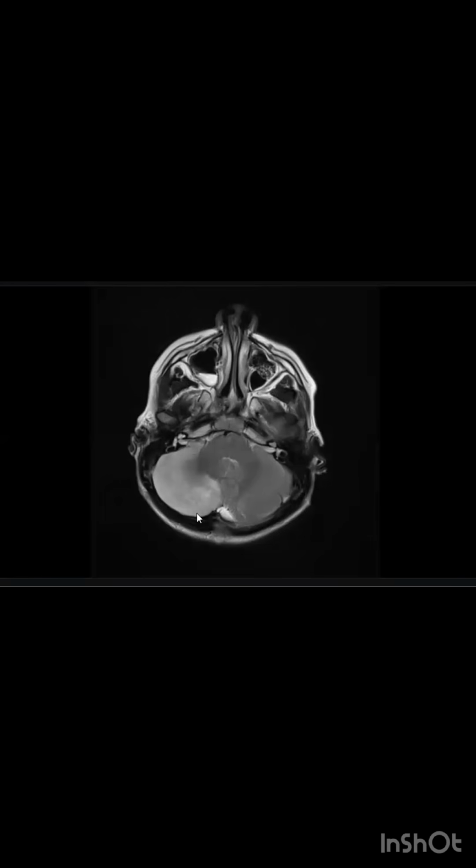Okay, you have to put the differential for stroke, but not taking a territorial distribution. You can put Lhermitte-Duclos disease, you can put cerebellitis, you can put lymphoma, but lymphoma will come in an adult patient.